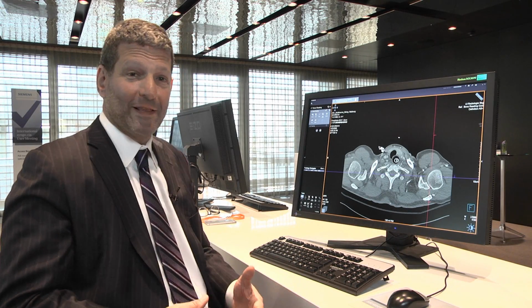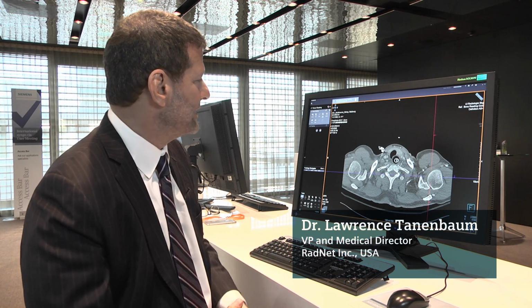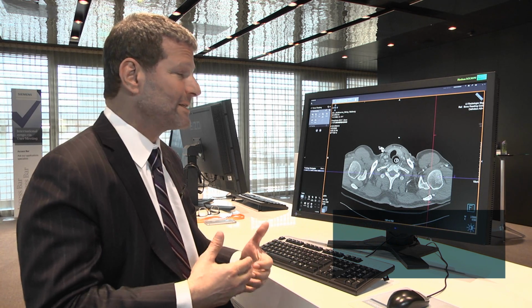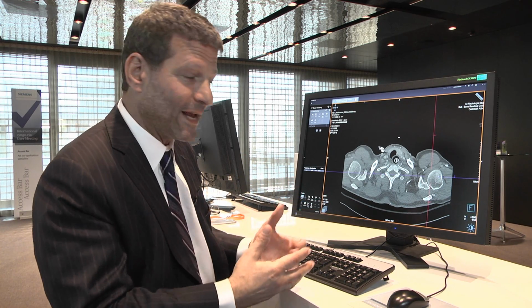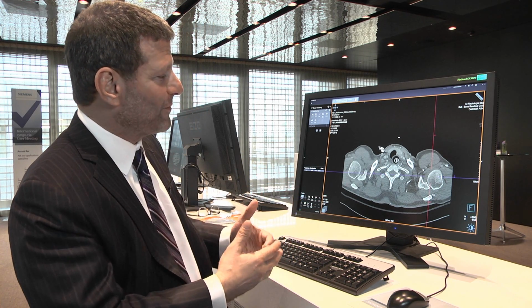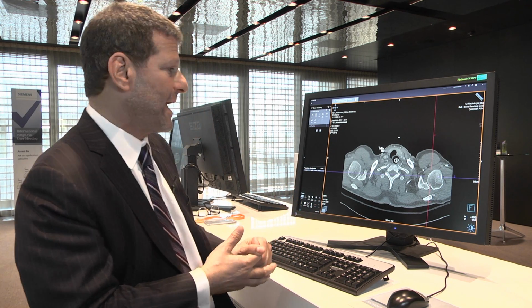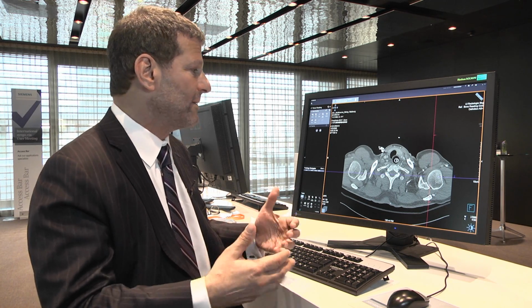I'd like to take this opportunity to share with you one of my favorite VIA applications. This unfortunate patient was in a skiing accident in Salzburg, it seems, and this is a borrowed case. I run my own ski meetings in Vail and Aspen, and we don't have these kinds of injuries, where the snow is nicer. But I'd like to share with you how this VIA application, this bone reading application, changes the way I interact and interpret data.